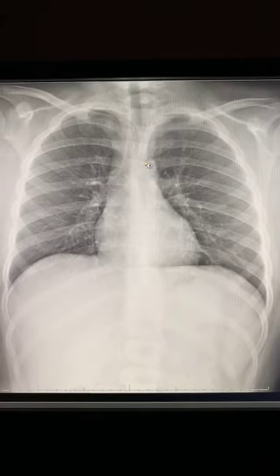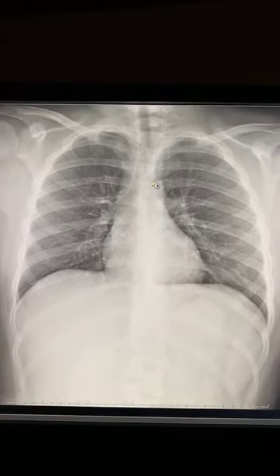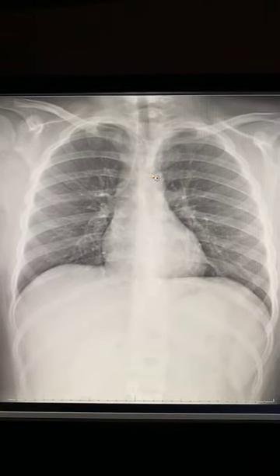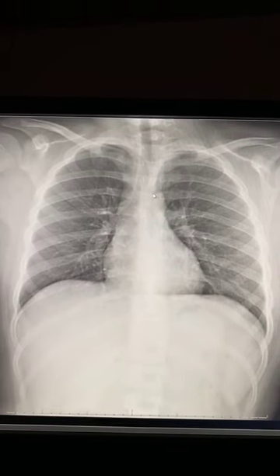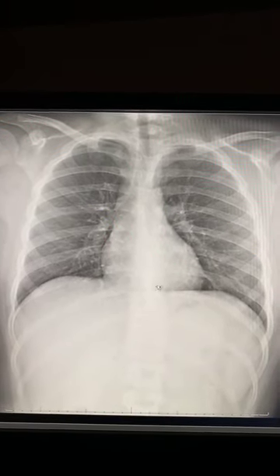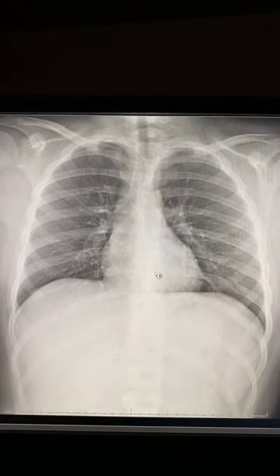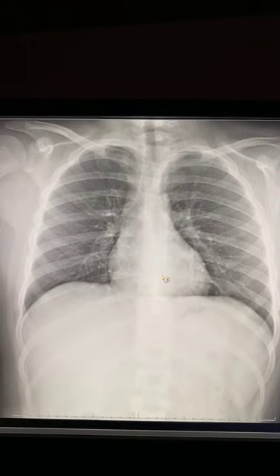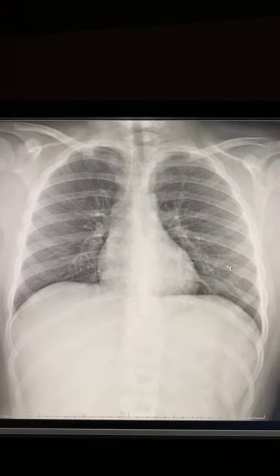All right, here we go. What else can we talk about on a normal AP? Oh, then somebody's going to ask you, is this an AP view or is this a PA view? You're kind of like, I don't know, it's all shot from the front, right? It kind of makes a big difference. If it's an AP view, if somebody's in the ICU, the patient's laying down, they can't stand up or anything. They shoot the X-ray from up front. They have the plate behind the patient, resting against the bed in the back of the patient. Well, that's going to accentuate the heart border, all right?